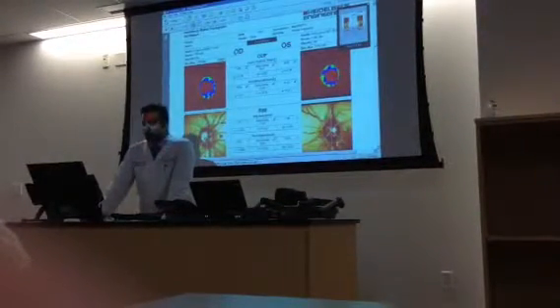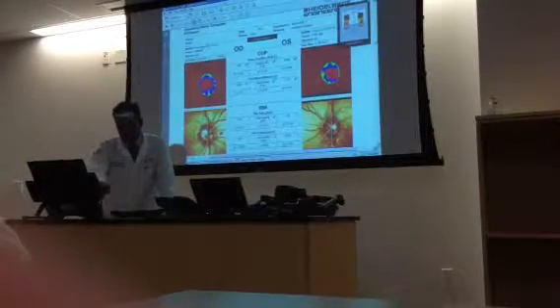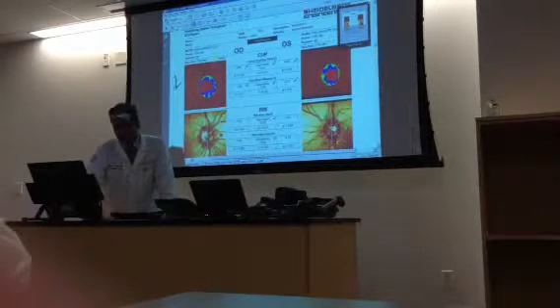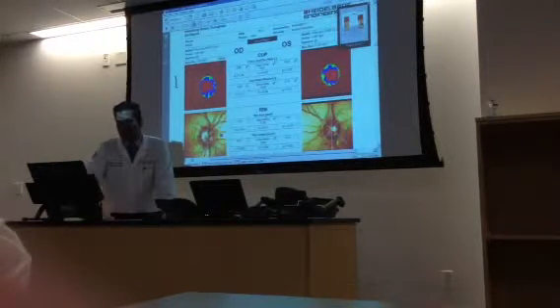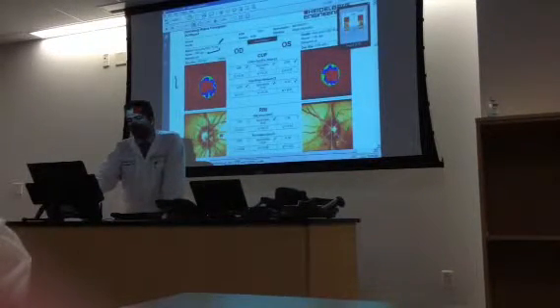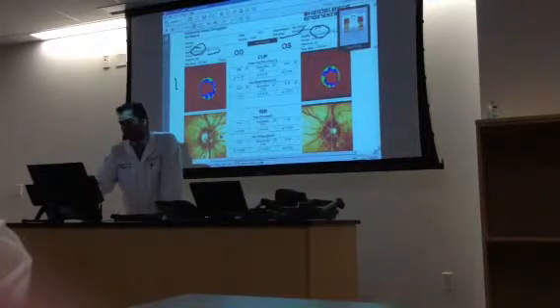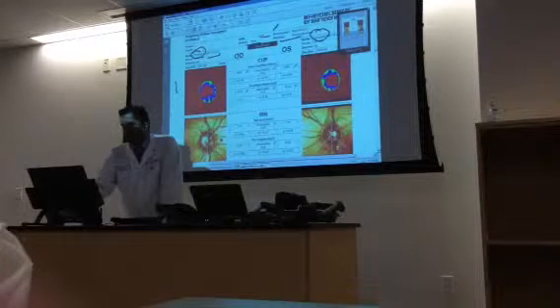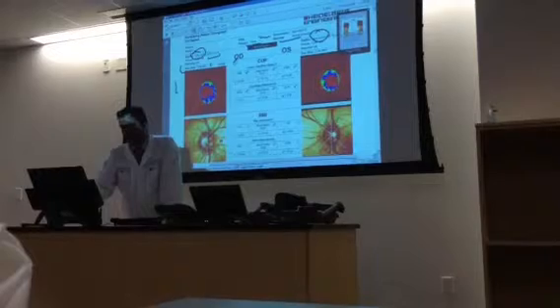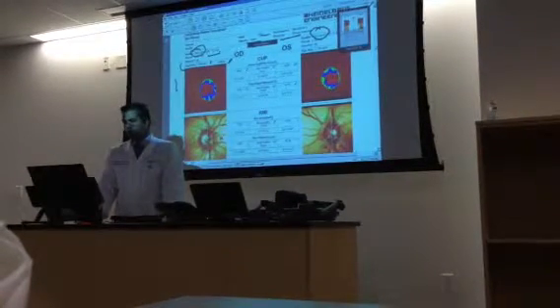So HRT reports are very similar. You have a fundus picture on top, like you're seeing right here. Fundus image gives you an idea of where the disk is, if it's centered, tells you the quality index in terms of standard deviation, also tells you if it's very good or bad, acceptable, gives you ethnicity. Disk size is given, and you don't have to remember whether it's large, medium, or small. It tells you automatically in parentheses that if it's large, then it tells you it's large.